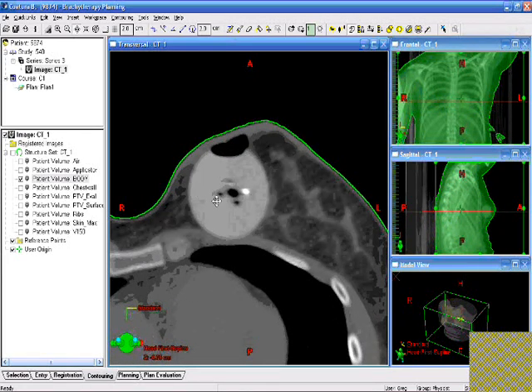There's another issue here, and you can see that it looks like there's air in the balloon here, but it also looks like there's air outside the balloon. And you remember how I mentioned on the other case that if you use the ellipse tool, it's nice to take a diagonal so that you're not starting in here and guessing where that should be. Imaging like this, which of this is inside the balloon and which is outside the balloon.